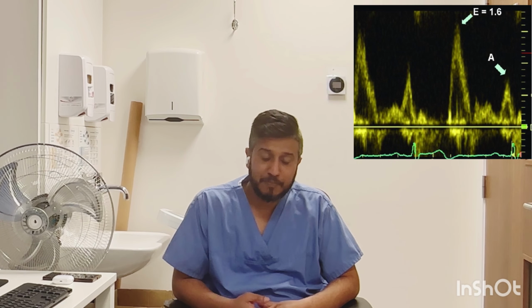Another way to look for mitral regurgitation is to look at the mitral E Doppler, the mitral inflow Doppler. With the pressure and volume increase, mitral E velocity increases as well. So as much as the mitral regurgitation gets severe, your E velocity starts increasing. So if your E velocity in a native valve is more than 1.2 meters per second, then you call it severe mitral regurgitation. So 1.2, you need to keep this number in your mind. If it's more than 1.2, it's going to be significant mitral regurgitation.